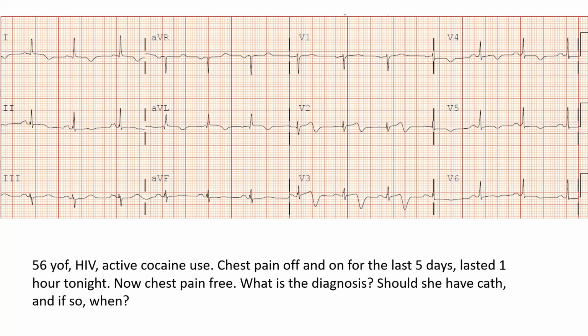Now, what does Wellens tell you? The original paper in the 1980s by the Wellens group showed that patients with this pattern, 100% of them had severe LAD stenosis proximal to the second septal. And 75% of those patients went on to develop a full-blown large infarct if they were left unrevascularized. So it's a high-risk feature that often progresses to a large infarct.